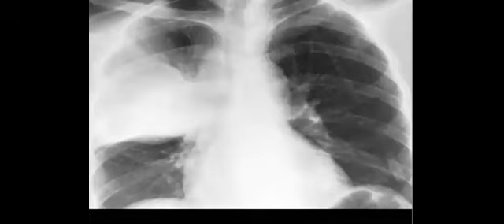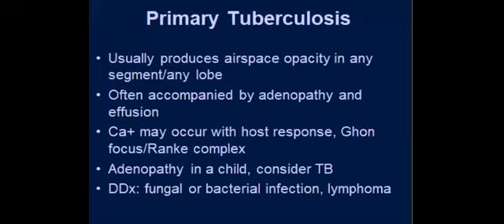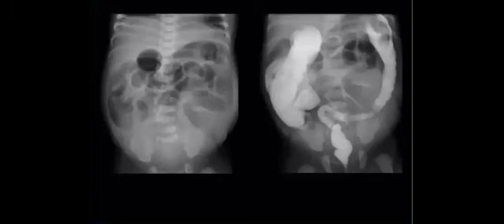I showed you this before in the chest revision. If it is a young patient and you find consolidation, you will mention anything, but don't forget what? Don't forget primary TB in the differential. Again, don't look at this one, look just at this one now.